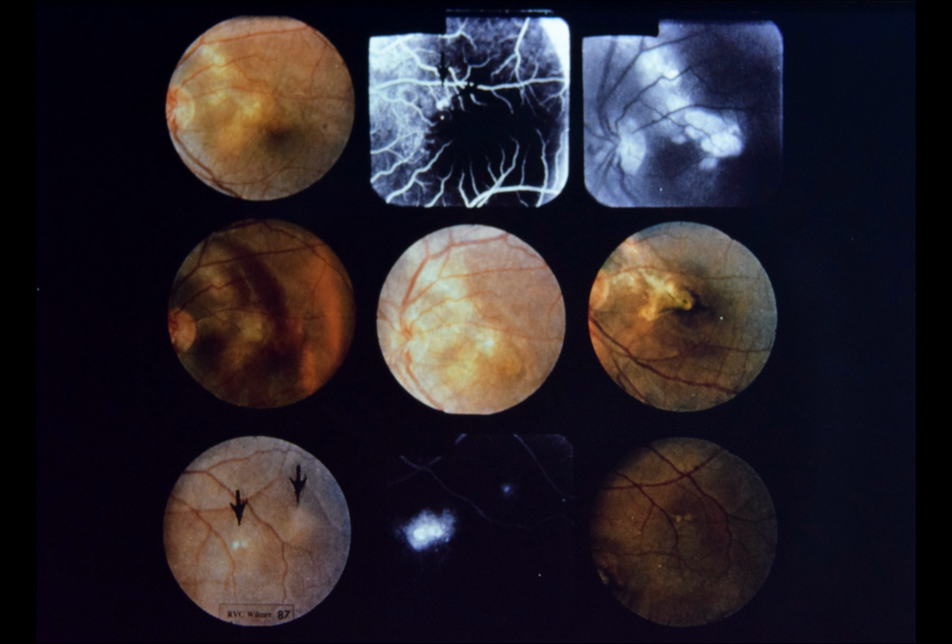Comment. Ocular lesions occur in 25 to 65% of patients with sarcoidosis. The frequency of fundus lesions is difficult to ascertain because anterior segment and vitreous inflammation often precludes careful fundus examination, as in the right eye of this patient. Fundus manifestations include chorioretinitis, periphlebitis, choroidal granulomas, optic nerve involvement, and peripheral retinal neovascularization secondary to retinal non-perfusion.